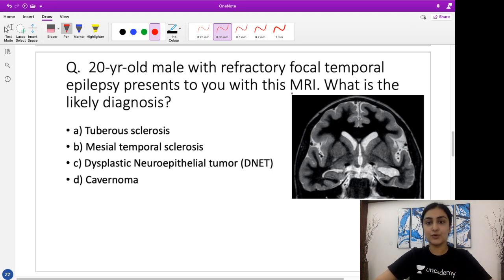So this, as I have told you, is an MRI. If I had not given you this information, how do we distinguish it from CT? Most often students have a problem distinguishing CT and MR at undergraduate level, right? So remember this thumb rule: always in CT the bones will appear white, whereas in MRI the bones should appear black. Particularly the cortical bone should appear black.